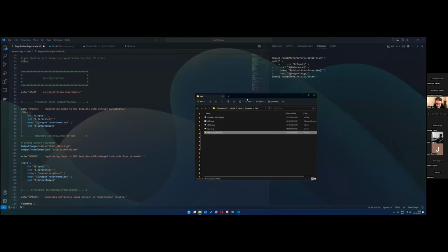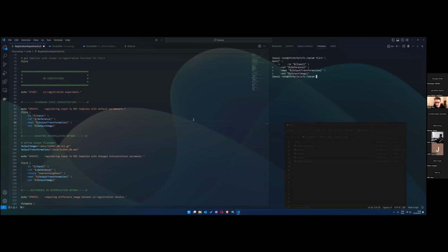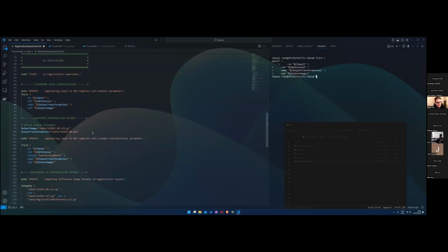To make things a little bit clearer in terms of what these processing steps and variables actually do, and how they can influence the registration, we're now going to do the same thing again, but we're going to use a different interpolation method. We've just seen the one image that all of a sudden got really smooth, because this change in resolution basically resulted in, for example, 4 voxels now being all mapped into a single voxel because of the lower resolution that we have. And the question then comes up, what intensity value does this voxel get?